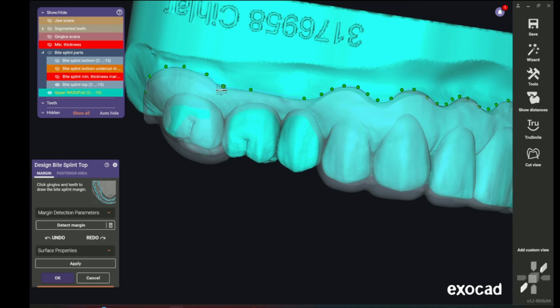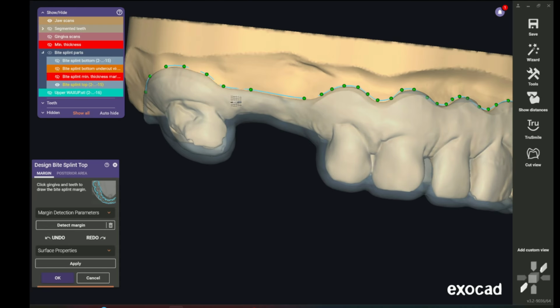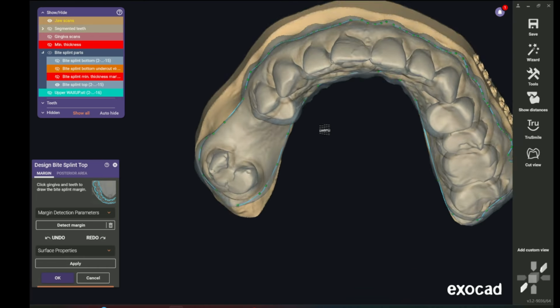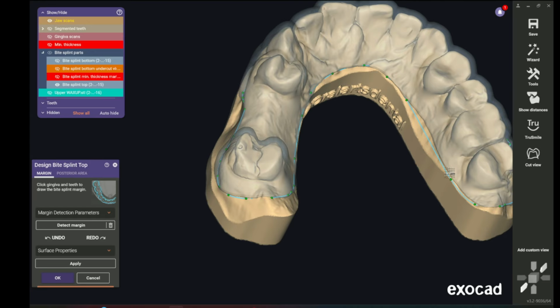Now this right here, we went straight across because there actually aren't any teeth here. This is just a pontic area. So we just come down, shoot straight across, make sure we give enough for support, and then continue on. And then on the lingual side, we're just going to give good coverage for good support. We're going to go all the way around the bottom, just like that.